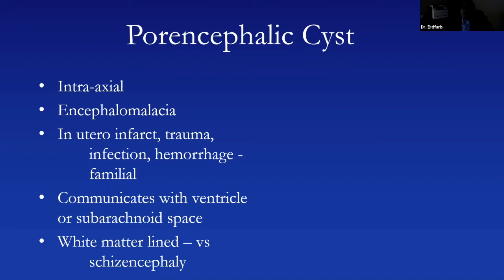And it oftentimes is a result of an in utero trauma or some sort of infarct, maybe hemorrhage, maybe infection. There are a couple of things that can cause this, but overall, it gives you this picture of, for some reason early on in life, you lost it. Oftentimes, this will be incidentally demonstrated.